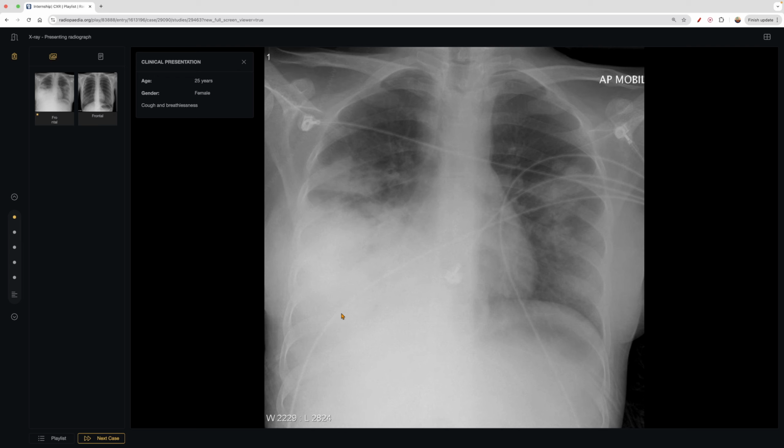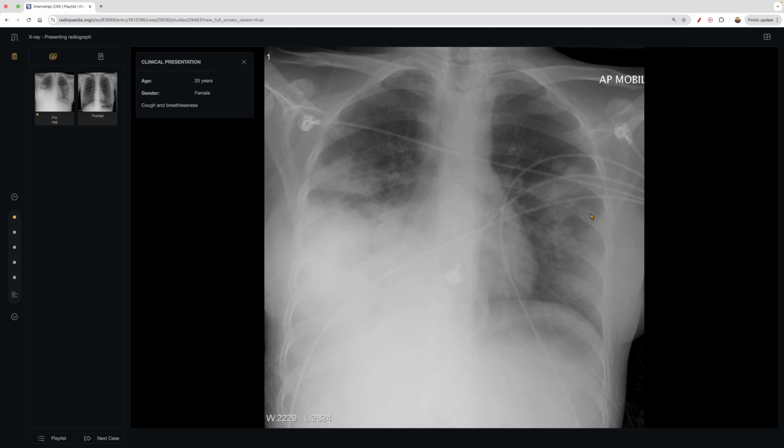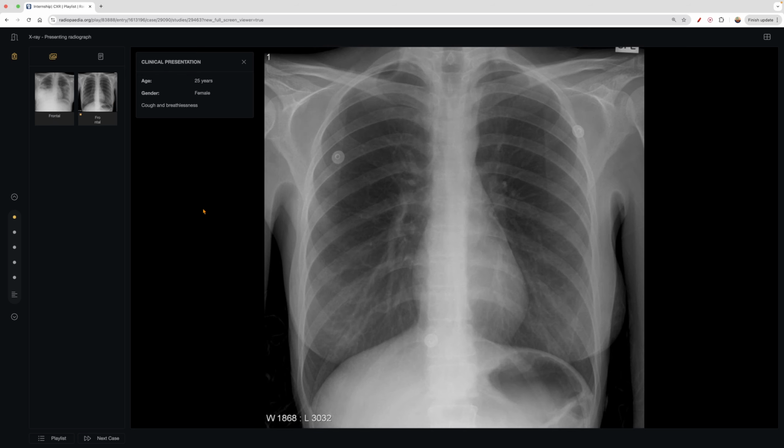This consolidation here. And then on this side, perhaps you can see it's kind of together, but maybe it's pneumonia, maybe not. But again, it doesn't look as crazy as it does on this side. So this is definitely the focus here. And what's impressive is this is the patient when they were sick initially, and this is the patient afterwards. You can clearly see the difference, from the heart borders and even that little opacification in the right upper lung. Not there anymore. And then likewise down here.